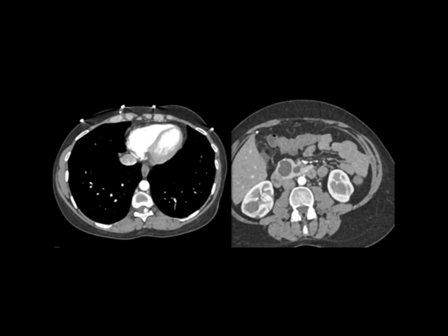There's a number of things with von Hippel-Lindau that you could think about, and they include pancreatic neuroendocrine tumors, cystadenomas, and pancreatic cysts. This could be cystadenoma. Then you see in the right kidney there are multiple vascular lesions consistent with multifocal renal cell carcinoma.